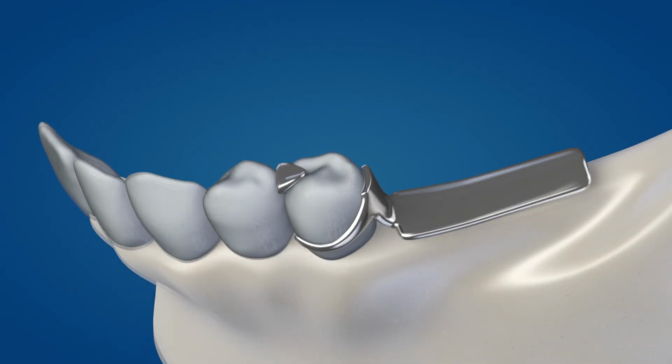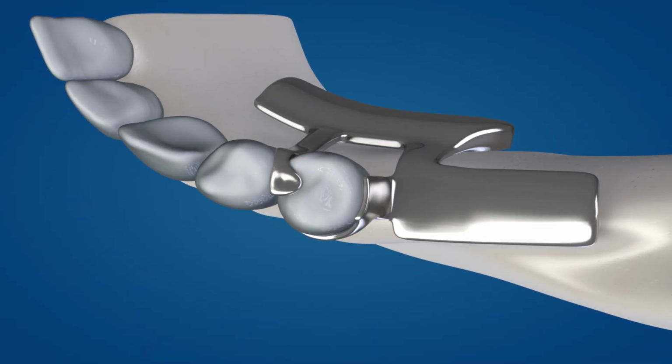When viewed from the occlusal, we see that this assembly displays similarities to the RPI clasp assembly. The similarities include a mesial rest and a distal proximal plate, with the major difference being an Akers retentive arm, which accounts for the A in the RPA designation. Understand the terms Akers and circumferential are synonymous in the historical literature.